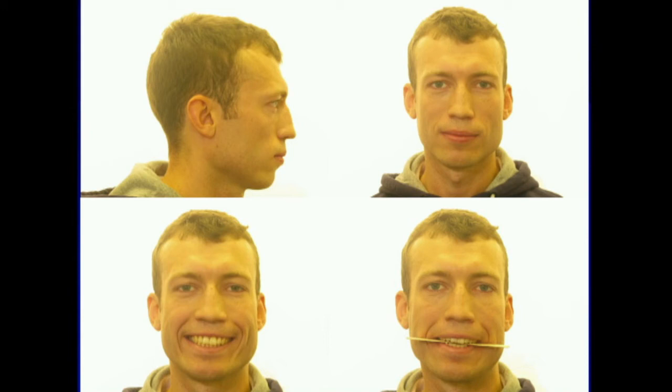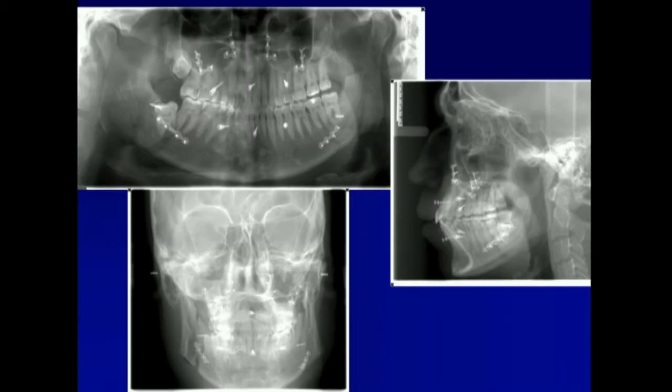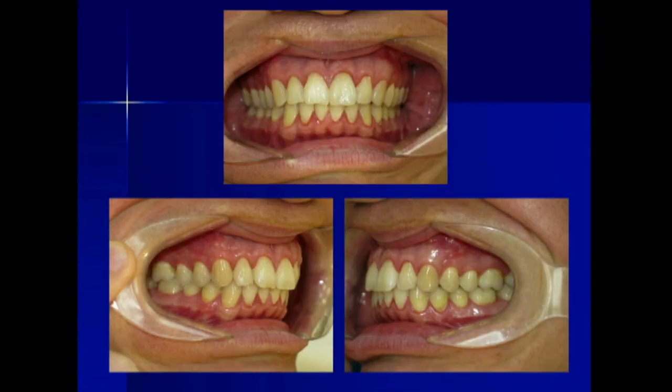You have just told that it's not a difficult case, but I operated him twice, and we discussed a third attempt. This is post-surgical X-rays. We performed bimaxillary surgery, and I tried to control the occlusal cant. And with occlusal cant, we have not a problem. We checked the occlusion. We didn't use the braces because the occlusion was perfect.